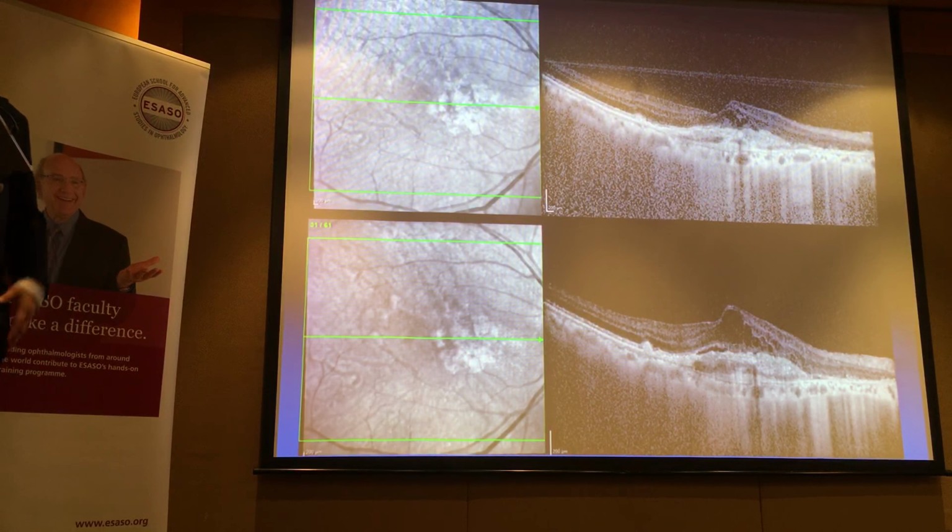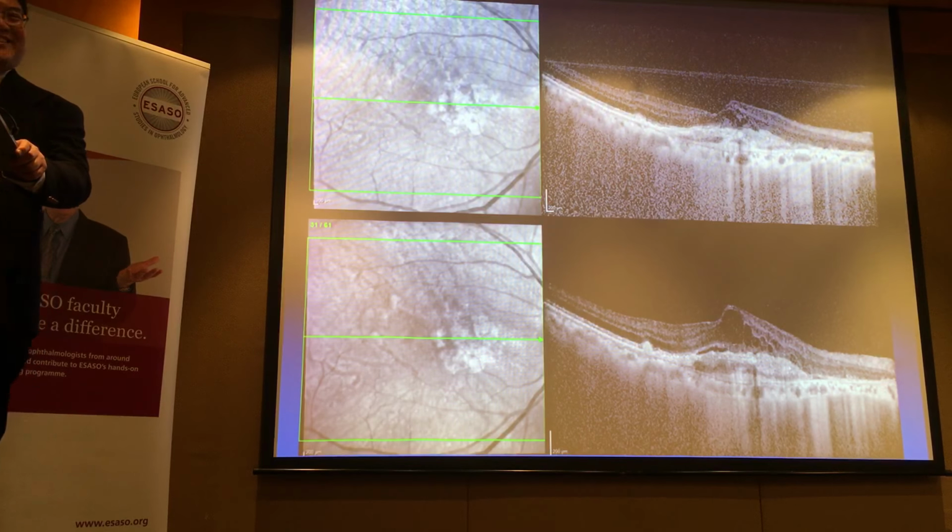And do you notice also that unlike the previous map, where you see the individual lines, you don't see them here because it's 61 cuts. That's my typical setting. You can go higher, by the way, but technicians will probably try to eat you up in some dark alley or something. But 61 is still, I think, reasonable enough. Okay.